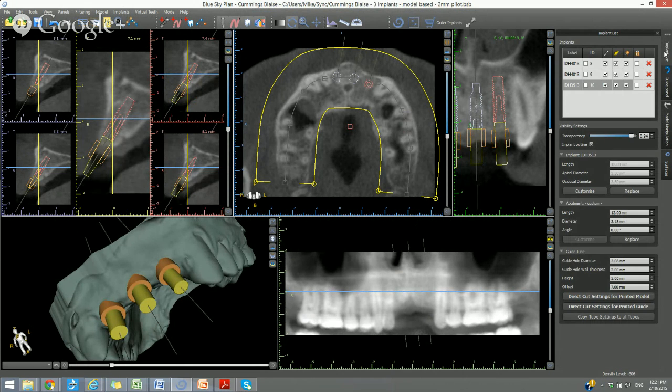And here's where you need to make 2 manual modifications. The first one is that the abutment diameter needs to be 1/10 of a millimeter less than the internal diameter of the metal cylinder. Conceptually, it needs to be a little bit thinner than the inside of the metal cylinder, so that the metal cylinder could go onto it and the post could support it.